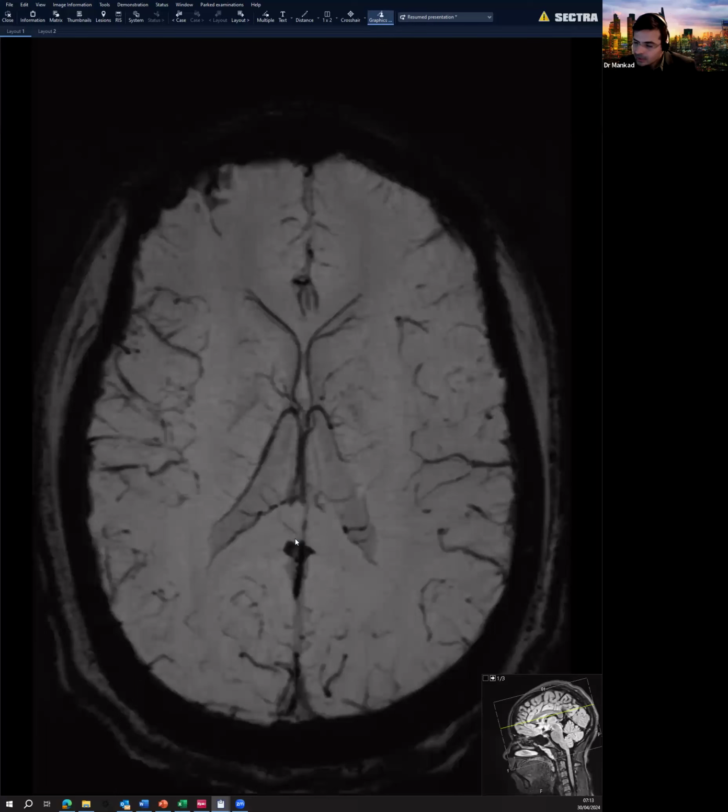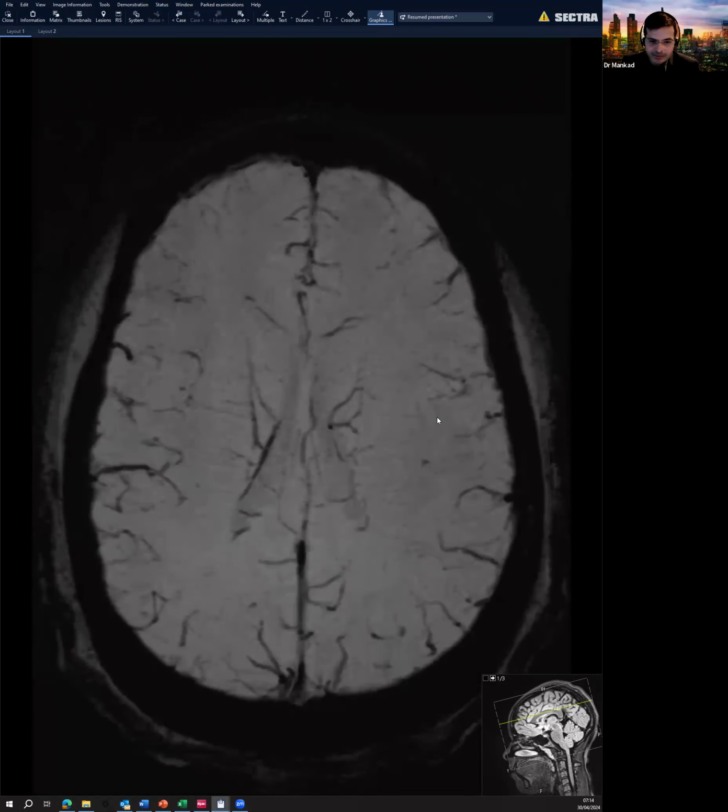And I say that with a little bit of hesitation because if it's a large fleck of calcification, yes, you can see it. Definitely of the MR sequences, this is the most sensitive for calcification as well. But for faint dots of calcification, I still rely on the CT scan. I'll be honest about that. But for blood and heme degradation products, this is extremely sensitive.